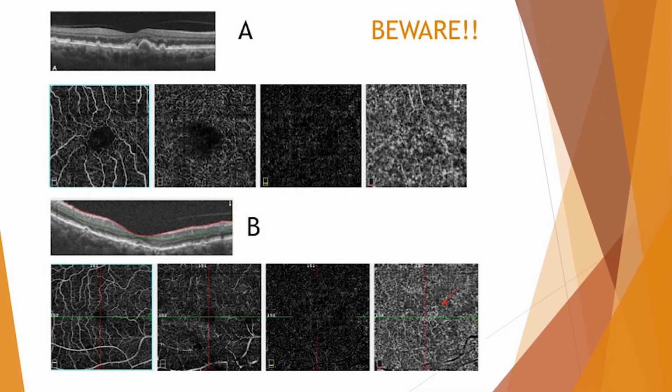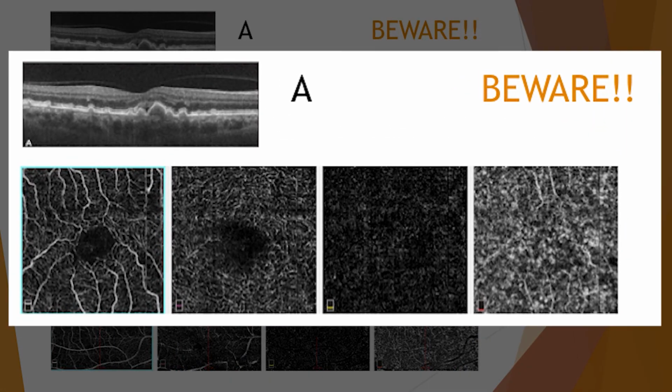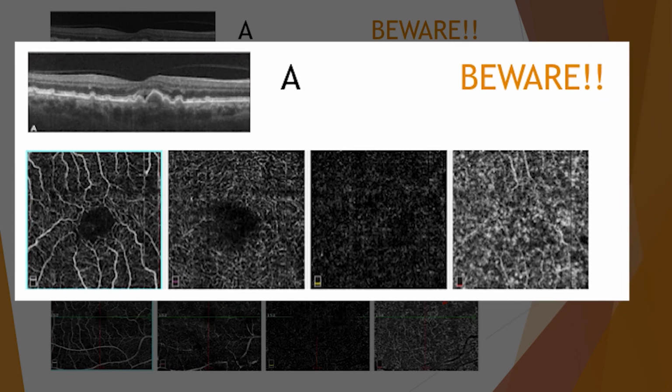And I want to end on this note, because I love this slide, because these are both my patients. And I thought these both looked suspicious. I know I should have made the B scans a little bit bigger, but in A, lots of drusenoid PED, and it's not really magnified, but if you were to look at it really closely, it looked like the one I just showed you. There were a few little serous pockets around that really big drusenoid PED in the center.